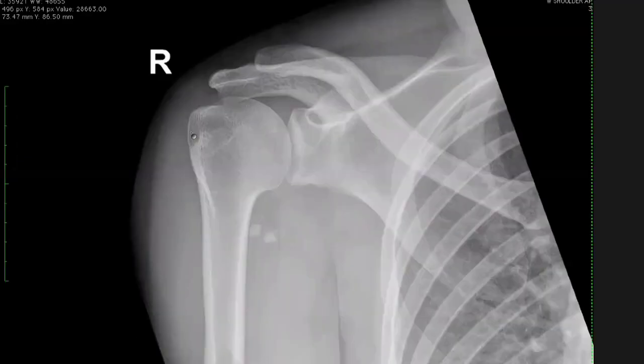So whenever you see these calcifications right next to the joint, make sure that you try to imagine which structure they could be in. Now, this one you said is in the muscle, and now we have proven it's in the muscle. So in the muscle, when you see round calcifications, think about whether these could be phleboliths, i.e. a venous malformation.